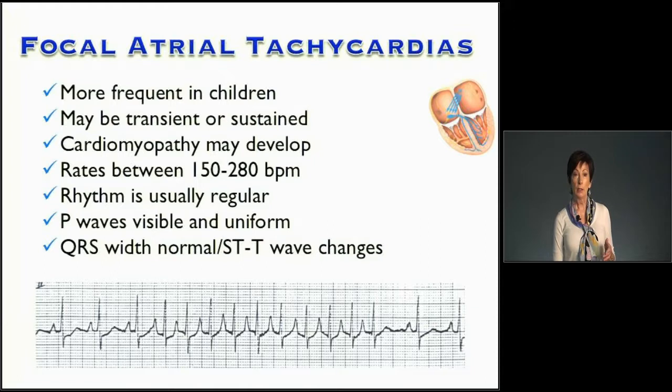The rhythm is usually regular, and it can be paroxysmal. And paroxysmal, that term means sudden onset, sudden cessation. And that's pretty much a term used when you see it start and you see it end. So if you look at the strip below, you see that we have 3 normal sinus beats. Then we have the early beat, where if it were just that beat, it would be a PAC, but it's followed by a lot of PACs. Essentially, that's really what it is.